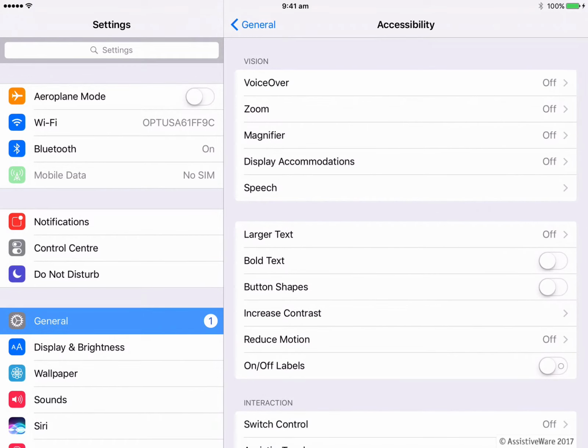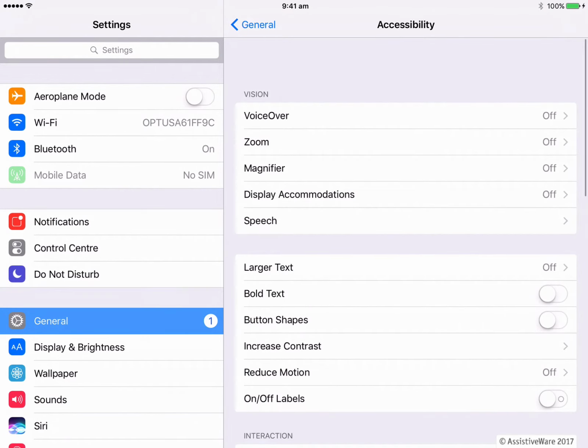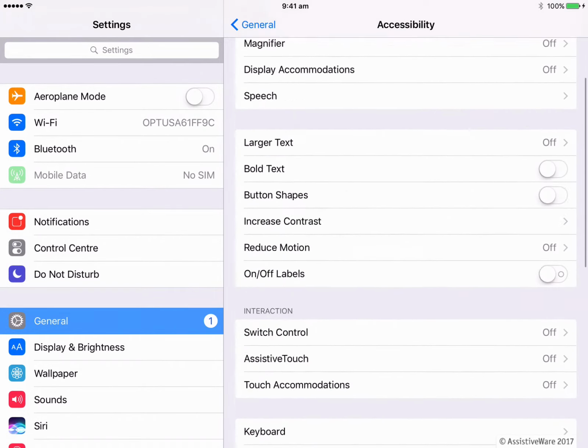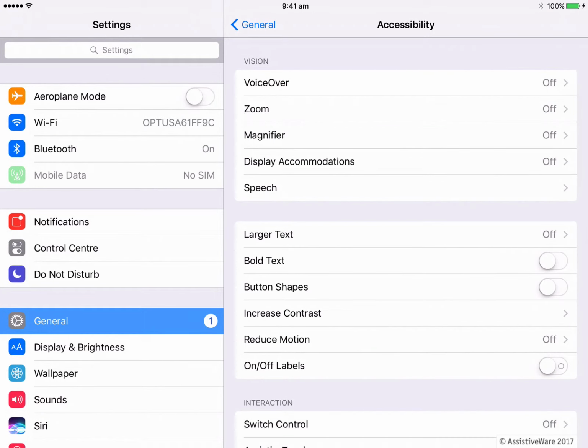These are the features developed by Apple to accommodate the different user accessibility needs. These accessibility features can be applied to not only Proloquo4Text, but also to any other apps you may use on your iOS device. Features like Voiceover and Zoom can be used within Proloquo4Text. I will quickly demonstrate Voiceover. The basic idea with Voiceover is that when I tap something now, I will hear what it is, and then to select it, I double tap on it.